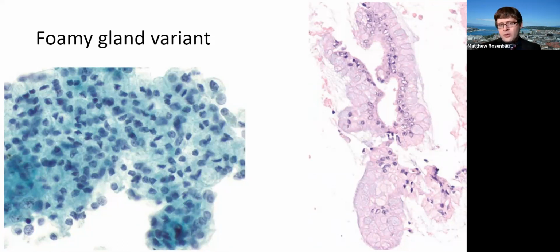There's absolutely no degree of the normal honeycomb architecture that you expect to see. You like to see the cells regularly spaced. They are completely irregularly spaced. There's no rhyme or reason to it. People say, oh, look for the drunken honeycomb. This honeycomb is well beyond that. There's no real semblance of that left.